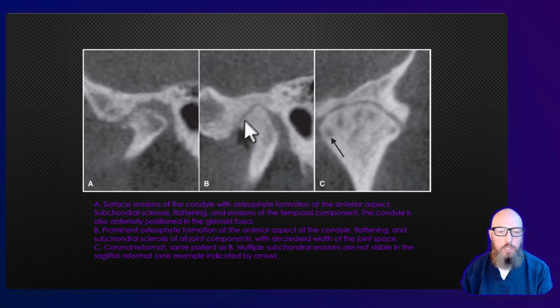But here's another osteophyte, very apparent anterior beaking of that condyle. And so that's a pretty large osteophyte. And what did we call these? Well-defined round radiolucencies right near the articular surfaces, those are subchondral cysts or subcortical cysts. You can also appreciate the loss of joint space here. This is not enough space for a healthy disc.